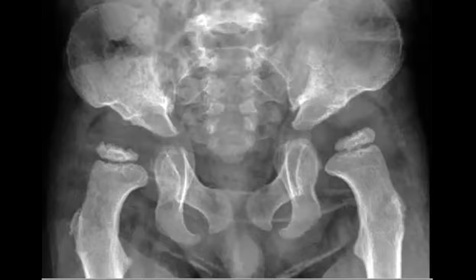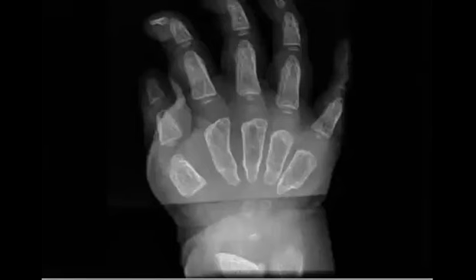Yeah. Then we reach the hand, which has the lovely appearance with, yeah, coxa valga, Sara, perfect. Tapered, Shayma, okay. And yeah, there is proximal pointing, proximal pointing ends of metacarpals, from 2 until 5, and maybe some small irregular carpals. And the hand gave you like a claw hand.